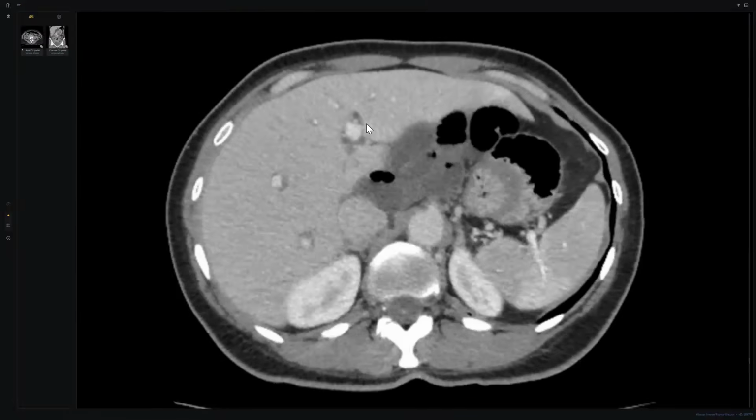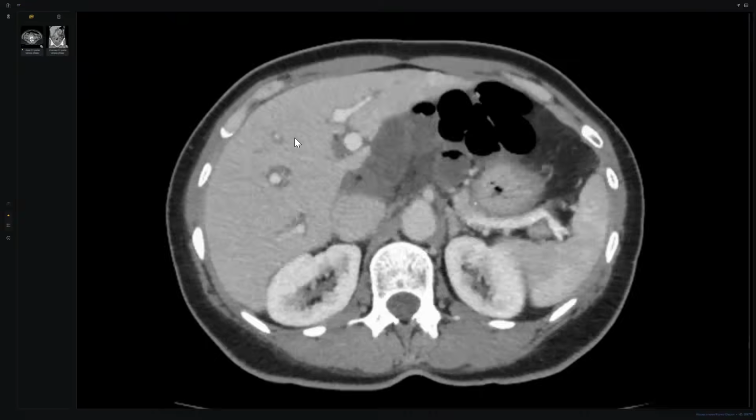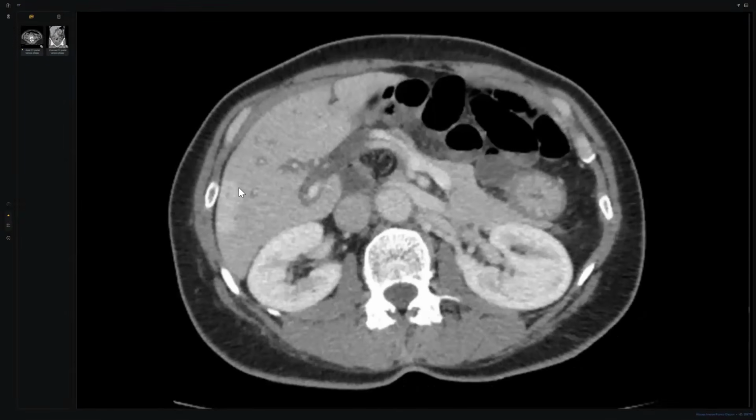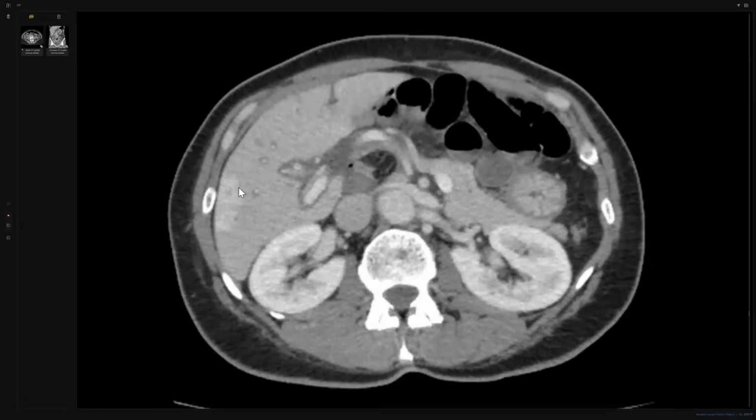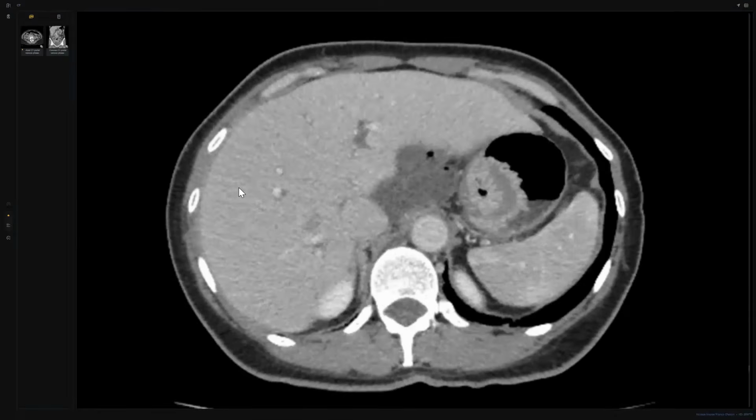Number two, you did very well when you explained here: this is periportal edema due to compression by the herniated bowel. Because you have a limited study, you can give some suggestions. Doctor, it may be transient hyperattenuation, it may be hemangioma, like this. But it looks at least benign.